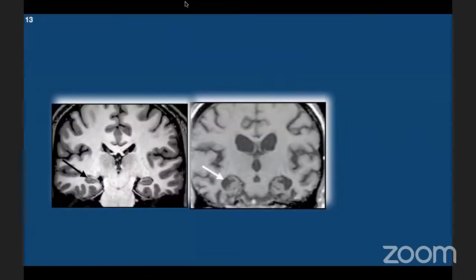The first image is the normal coronal slice in T1. Anatomically, the hippocampus is forming the medial wall of the anterior pole of the temporal horn. In a normal healthy individual, the anterior pole of the temporal horns are not seen. And when the brain atrophies, the hippocampus also shrinks. The ventricular dilatation coupled with hippocampal atrophy causes the visibility of the temporal horn, as you can see here in the second image. This can either be from age-related atrophy or Alzheimer's disease or whatever.